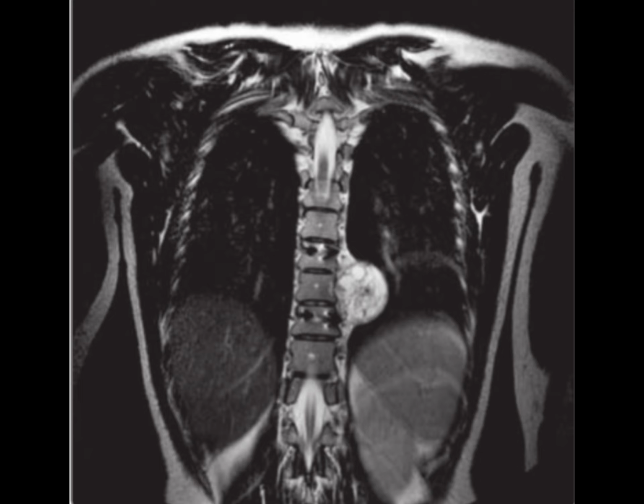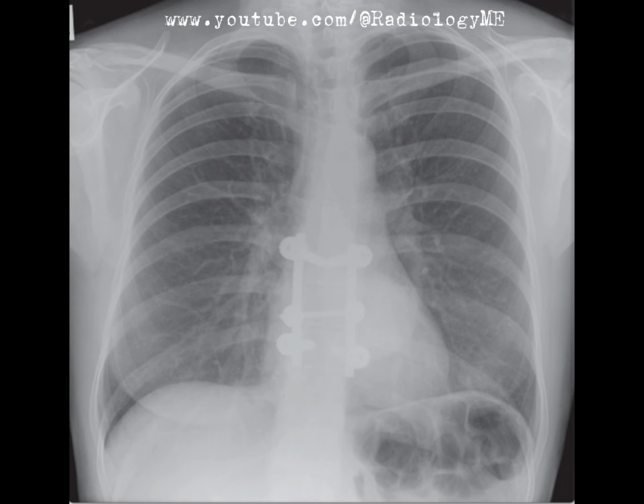So, to wrap this case up, my leading diagnosis would be a recurrent nerve sheath tumor, likely either a schwannoma or neurofibroma. We've got clear imaging findings that align with this, and it fits well with the clinical background of previous spinal surgery. If I were in the Viva exam, I'd definitely anticipate questions around the differential diagnosis of a paravertebral mass.